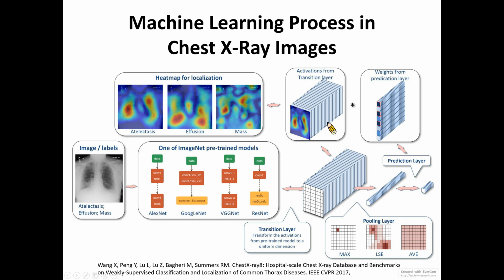It is called augmented image data store. So it can do the resize for you, but I will show you later that it doesn't work in our chest X-ray data because we need to read the images from the DICOM files. So we need to do different things in this step. But for now, we just follow the MATLAB tutorial and resize the images.